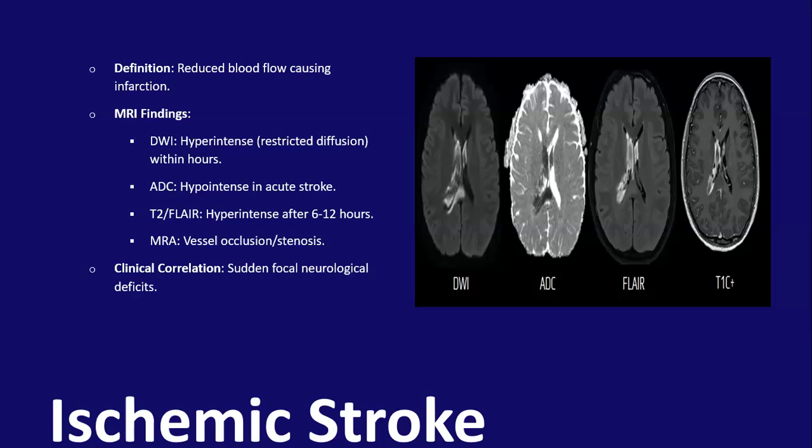Then you look at the neurological deficit in the patient. For example, the middle cerebral artery is divided, and this is just an example. You don't have to know the specific details, but you'll see a patient, for example, who has presented with a middle cerebral artery M4 segment ischemic stroke. So you would see that the pathology would be in the segment of the cortices relative to being an entire hemispheric acute ischemic infarct.